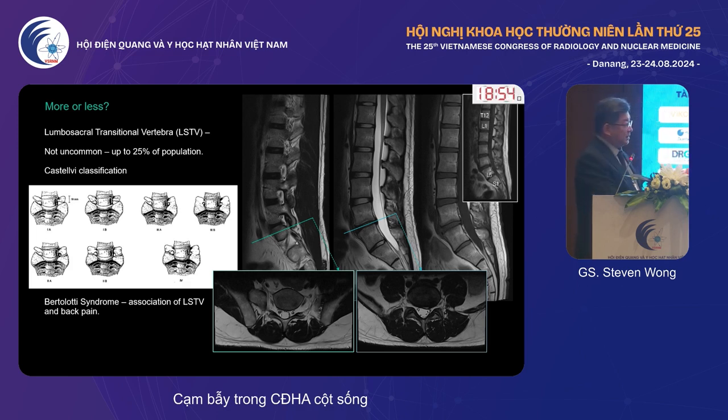The clue on the axial is that you have a large bony mass on the lateral aspect of the vertebral body, and it's encroaching on the anterior neuroaxial canal. And this can be the one that's causing the nerve root impingement also.